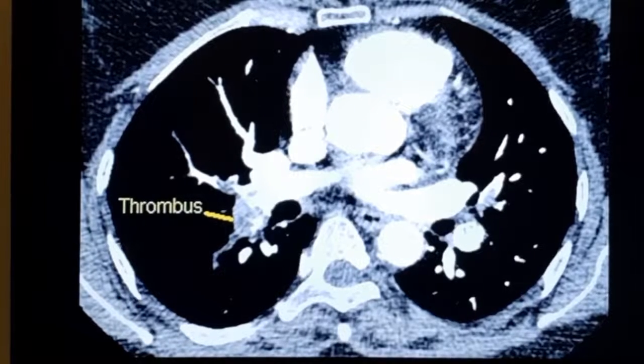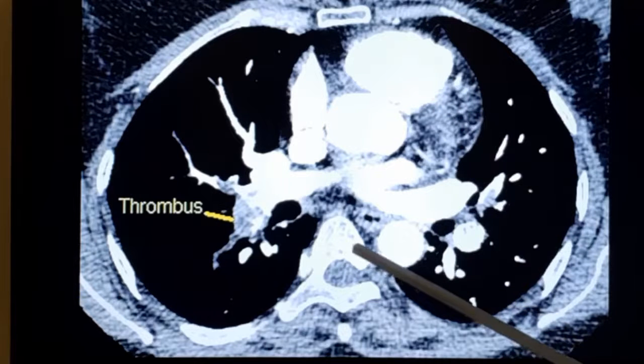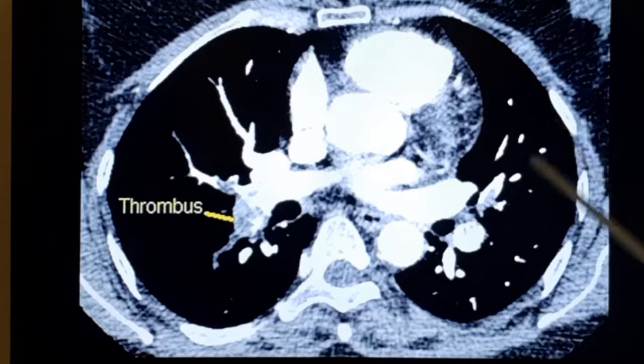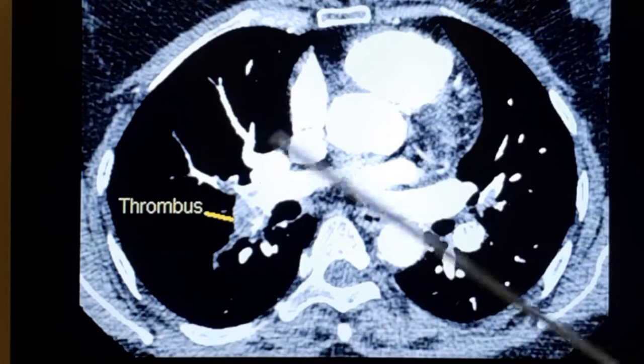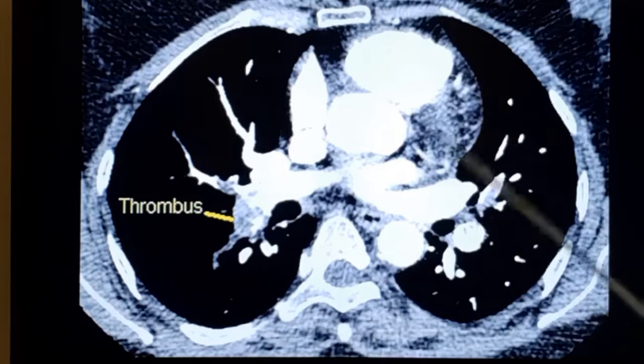This is a section from a contrast enhanced CT of the thorax. These are the cardiac chambers. This is descending aorta, vertebra, and the rib cage. Lung is not seen well because this is not a lung window. It is a vascular study. Only the contrast enhanced regions are seen. Myocardium is seen as partially contrast filled.